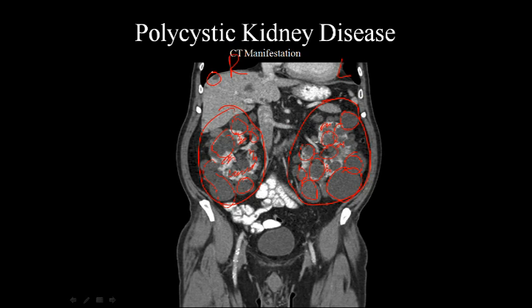Another thing to keep in mind is you see the liver here, and you actually see cyst in the liver as well. So this person has the triggering effect that has allowed the liver to gain cysts as well. We presume, based on there being calcifications here, that this patient is probably a little more elderly, or probably at least in their 60s, based on there being a significant amount of calcifications in the arterial system.